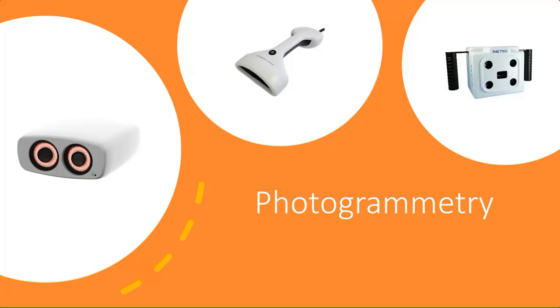So this program is actually going to be part of a series of programs we're doing on full arch on the digital all-on-4, and what we really wanted to focus on today was the design aspect. I want to introduce you a little bit to what we're seeing with photogrammetry and how to integrate photogrammetry into your design software.